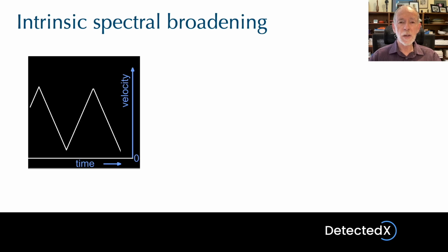So the idea is there is a thread moving in a water tank. The machine places the Doppler sample volume on that thread and looks at the echoes scattered from it. When the thread's moving, those scattered echoes will be Doppler shifted. So it's essentially an ideal target, a single moving object moving with a single speed.